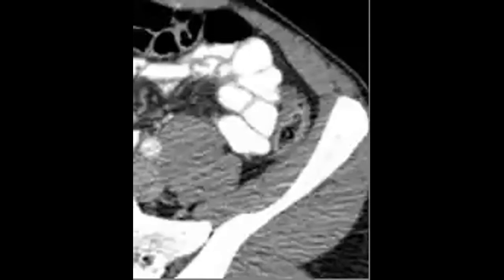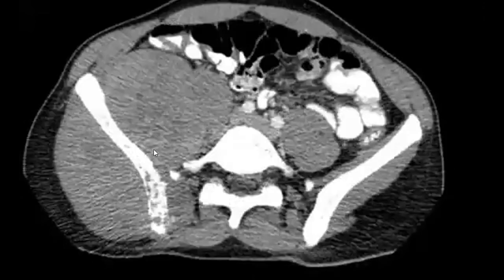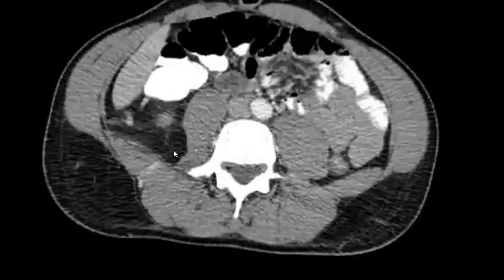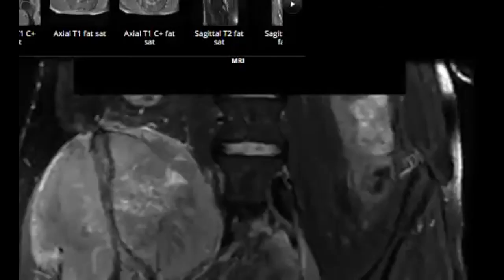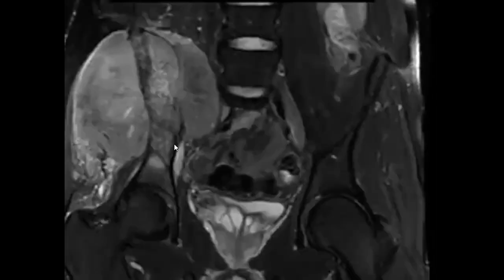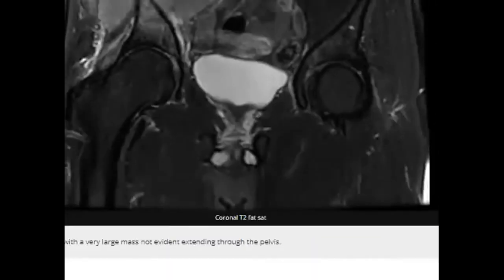Okay, so in the bone scan you can easily see the differences here, and this is the good thing. When you go to the CT, it will be much easier to detect the soft tissue and the destruction. Maybe on MRI it will be even easier. Now you can clearly see the soft tissue that was displacing structures on the X-ray. I think everyone will agree that I like to go back to the X-ray to see what was going on.